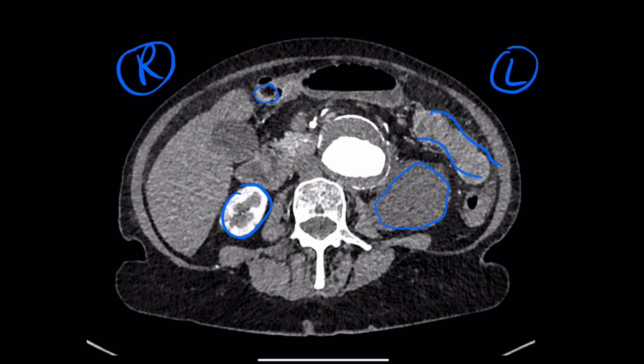And then there's the elephant in the room. This is abnormal. That's the largest vessel in the body, the aorta, and it's not a normal aorta. It is larger than it should be. We've got the inferior vena cava here, but the aorta should be maybe 2.5 or 3 centimeters, which is normal, and this is much enlarged. It's probably 6 centimeters.